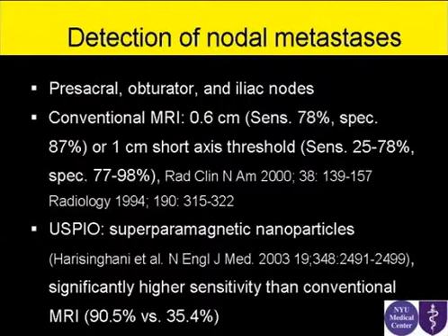And in my experience, speaking about experience, I have to look at the volume of tumor also, whether it's on the MRI, spectroscopy, or the biopsy. If there's a small volume of tumor, and I see a node with the short axis between 0.6 and 0.7 or 0.8, I tend to undercall it. If the patient has a large volume of tumor, then even a node 0.6 cm short axis should be really noted and specified to the surgeon, okay?